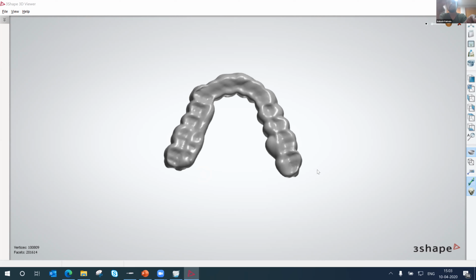But if it's a printer like Formlabs, which is integrated, you can directly choose Formlabs. Again, this can be a question to support, but you can definitely integrate if you have the CAM for that.